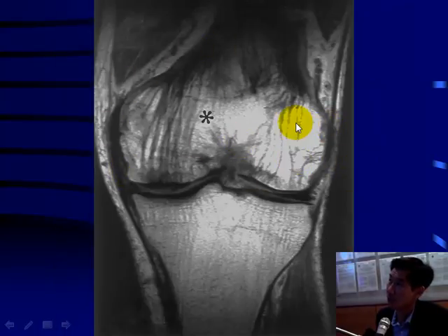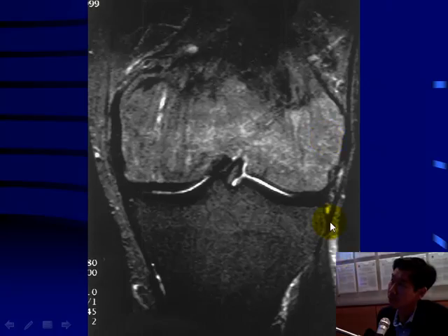In this patient with a distal femur Paget's we saw earlier on X-ray, very prominent trabecular pattern of distal femur compared to the proximal tibia. But yet again, notice how you have these normal interspersed areas of yellow marrow on this T1 weighted sequence. This process, even though it's forming new bone or distorting the bone, it's not displacing the fat, completely obliterating the fat. It's not occupying the entire medullary space. You can still have normal yellow marrow fat between the processes.